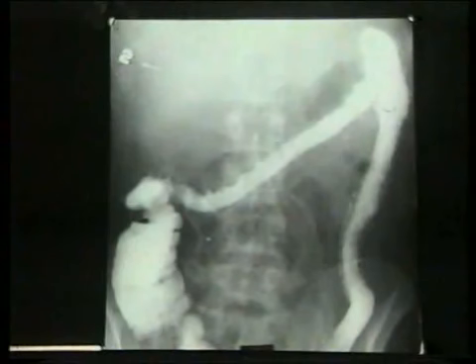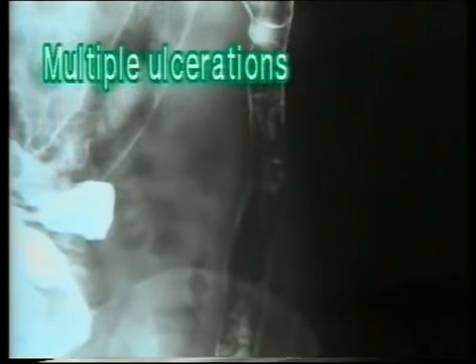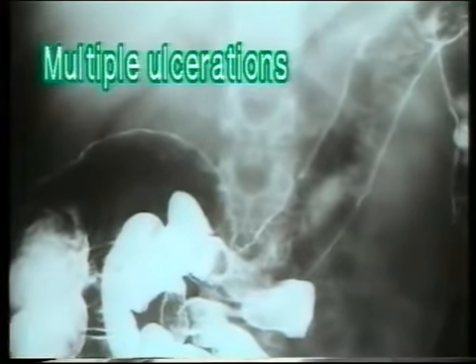The changes of ulcerative colitis always start in the rectum, sigmoid and descending colon and later progress to the right side. In early stage, the colonic mucosa shows multiple ulcerations seen as rough or granular mucosal pattern with large ulcers seen as tiny outpouchings of barium from the colon margin. Note the rough and granular mucosa in this barium enema and of course the loss of haustrations from sigmoid colon to the hepatic flexure.